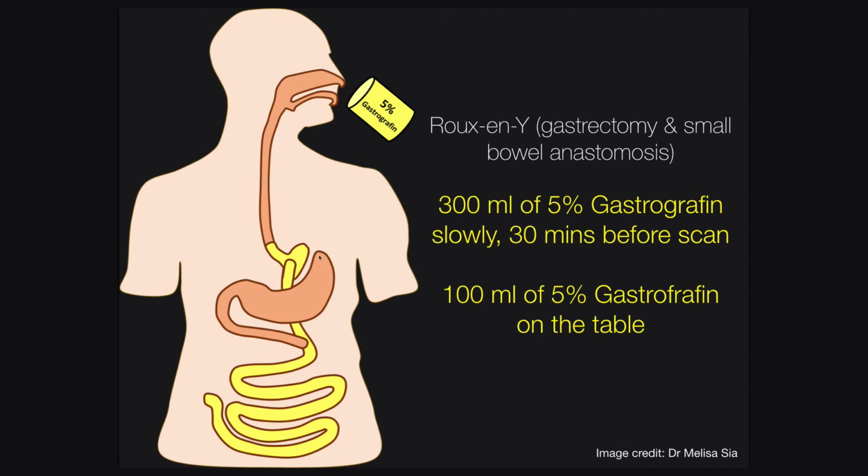So if someone's had a bypass, there'll be two anastomoses. You've got the more proximal one here, which is an esophagojejunal anastomosis, or an anastomosis between a bit of a pouch of the stomach and the jejunum. And then there'll be this second anastomosis between two different parts of the jejunum, so a jejuno-jejunal anastomosis. In terms of nomenclature, this is known as the alimentary limb, okay? Because the food passes down that bit.